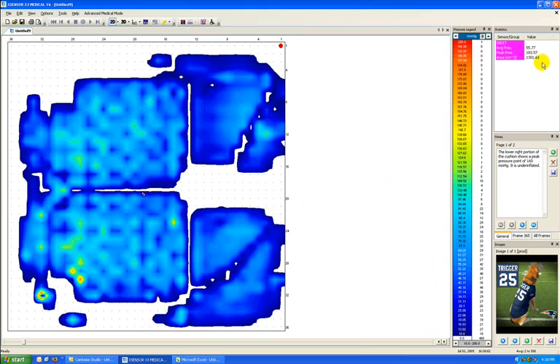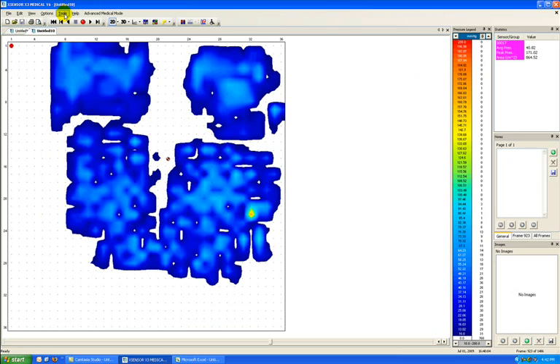So I can see on the right here that I had an average pressure of 55.7, peak pressure of 183.57, and a coverage area of 1301 square centimeters. And this represents, accurately, frames 2 through 500. I could apply this to as big or as small a range as I wanted. It's a good way of indicating a representative picture of the patient sitting on the sensor pad.